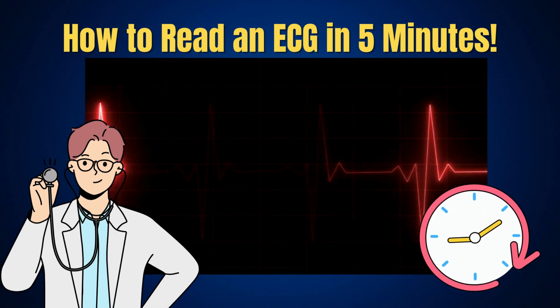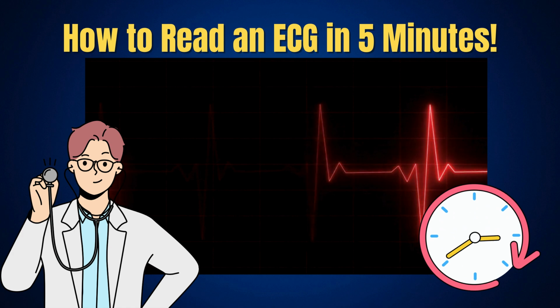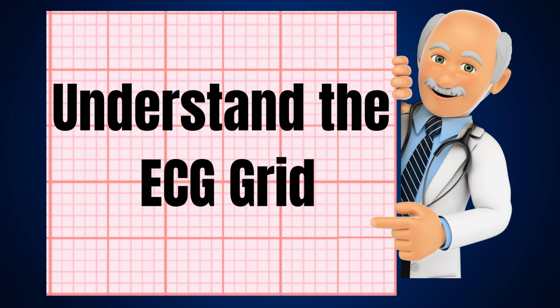Ever wondered how to quickly understand an ECG? In just 5 minutes, I'll show you the basics to confidently read any ECG. First, let's decode the ECG grid.